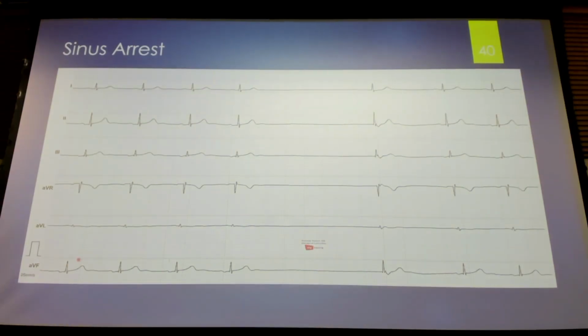And here we have our PQRST, good. And then if we march these out, we should have something here. We should have something here. So we're missing at least 2 complete cycles in between. And then we start again, a little bit of an abnormal beat here, but then we've got our PQRST. What does this look like to you guys?